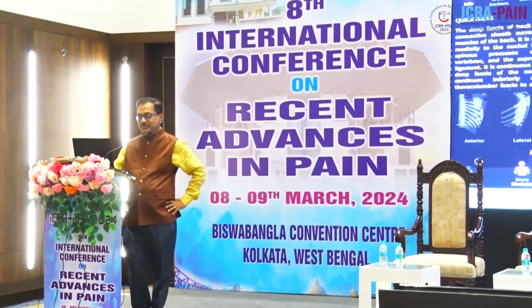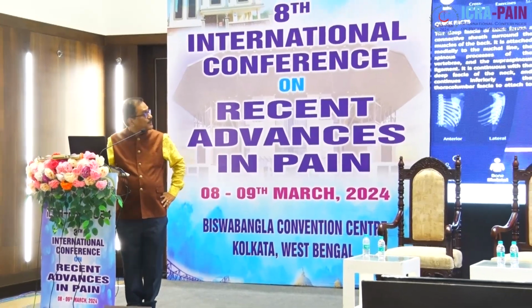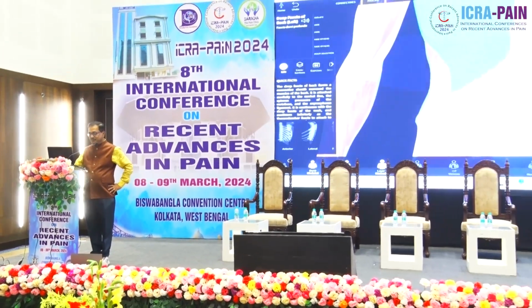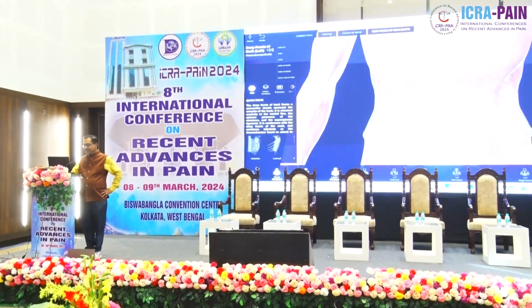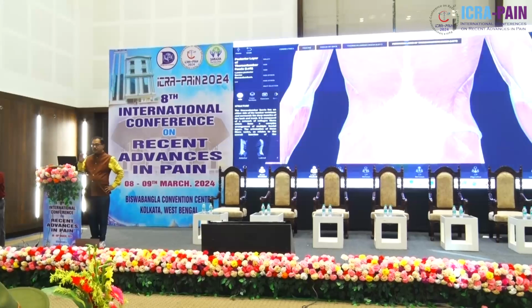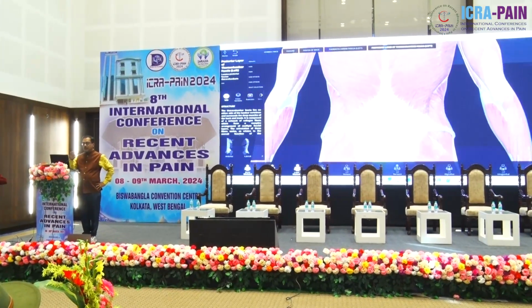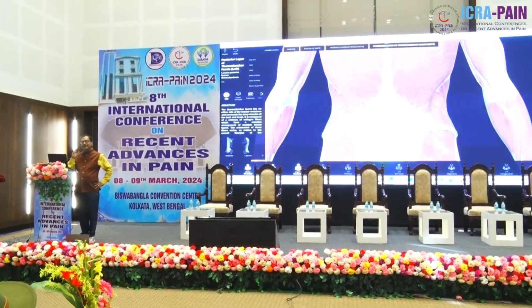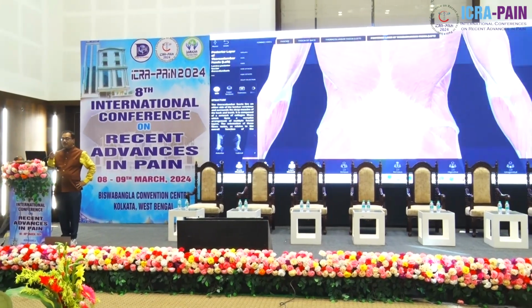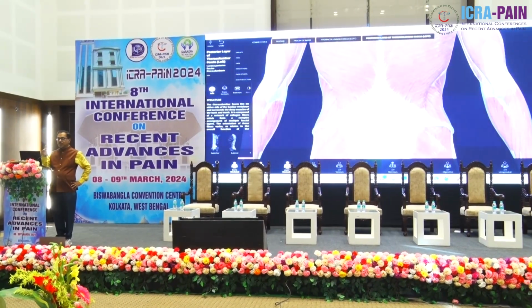So what is this? What is coming there? It is deep fascia. And here, thoracolumbar fascia. The thoracolumbar fascia has how many layers? 3 layers. This is the posterior layer. There is a middle layer. Middle layer and posterior layer. What are the muscles in between?